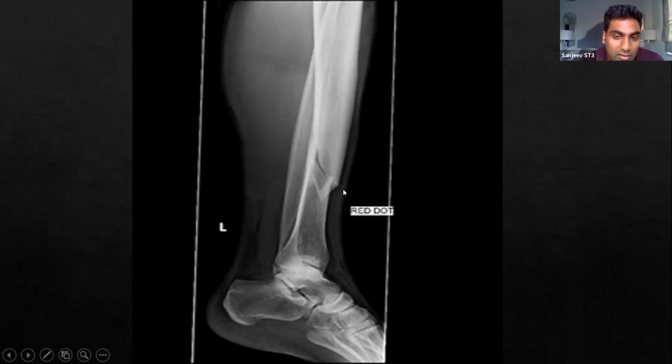The other thing I'd mention is whether it's intra or extra-articular. But to be honest, because you mentioned this is mid-tibial, it's assumed that it's not. But it's a good thing, if it's on there, to say it's extra-articular. It's just such an easy win. It's those little things that, if they put it in the exam and you're not exactly sure what they have in the mark scheme, it's safer to just mention everything. Does that make sense, guys?